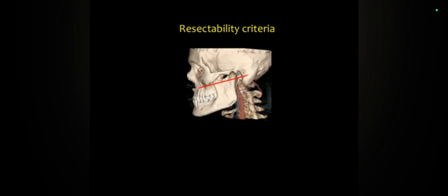If you have any confusion, like if you kept the neck like this, the cut of how you acquire may be different, and the notch gets altered depending on the angle at which you have acquired. But on the sagittal, the notch will not get altered at all. So you take your cursor on the sagittal if you are in doubt and see whether the disease is going above that level or not.